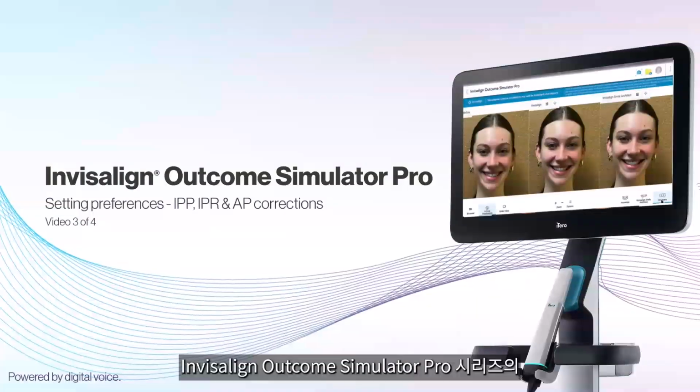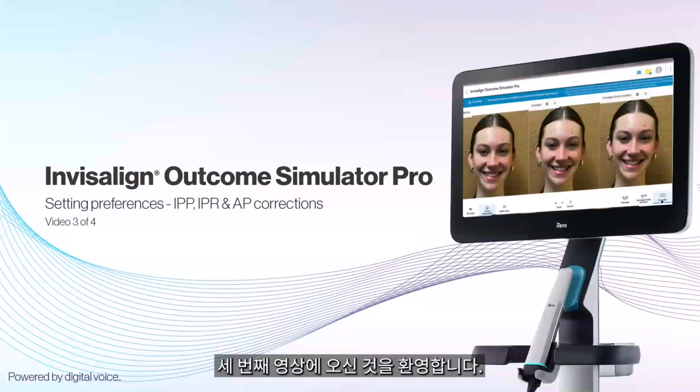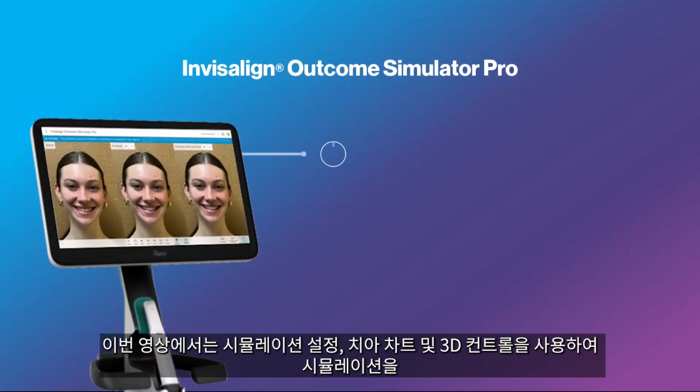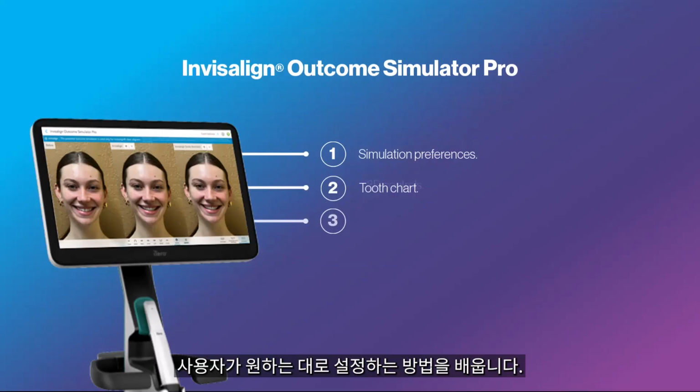Welcome to the third video in the Invisalign Outcome Simulator Pro series. In this video, you will learn how to customize your simulation using simulation preferences, the tooth chart, and 3D controls.